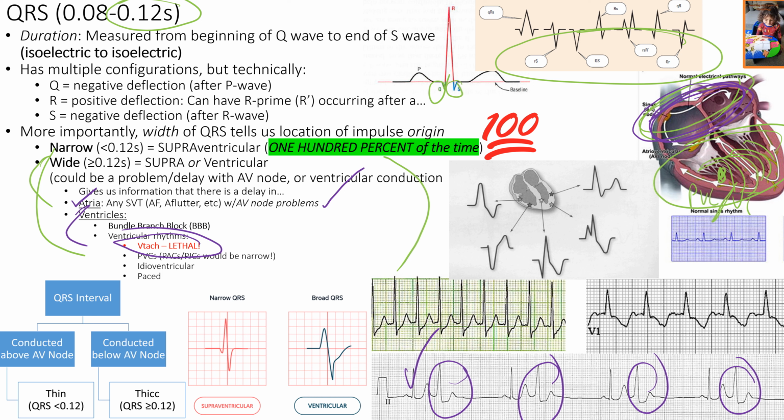Okay. Would that be what you were talking about with going into torsades, if that was just over a little bit? Exactly. Yeah, I think that's what I was kind of going for here. But yeah, if this was right on top of that T wave, then you can be at risk for torsades, right? That's another important cause of torsades.